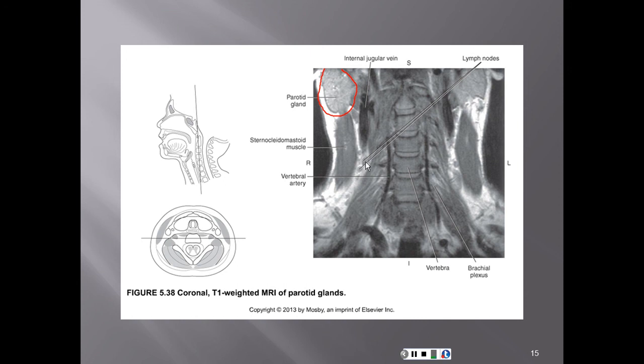Things in the neck that have this bean-like appearance, it's not vascular. You know it's not a vessel on end. We just attribute to lymph nodes.